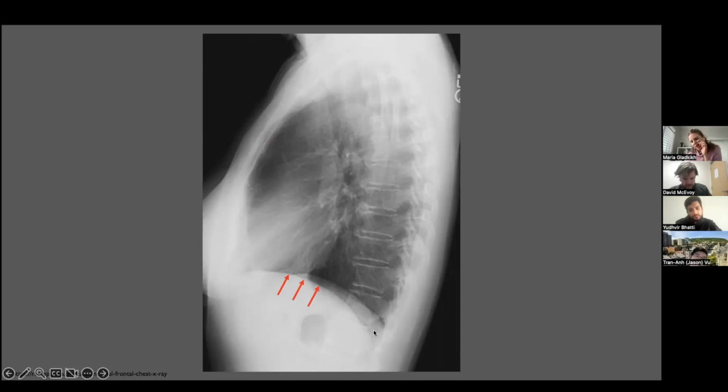So the left diaphragm actually goes and stops at the level of the heart and then doesn't continue further. The right diaphragm, however, continues all the way through, essentially making contact with the anterior body wall. So it's always the right diaphragm that you can see in its entirety, and the left diaphragm is the one that stops right at the heart.